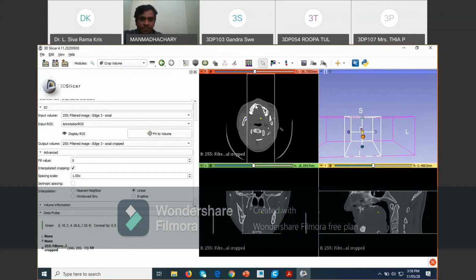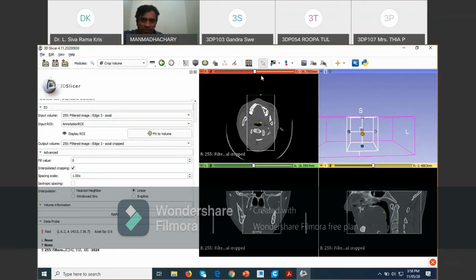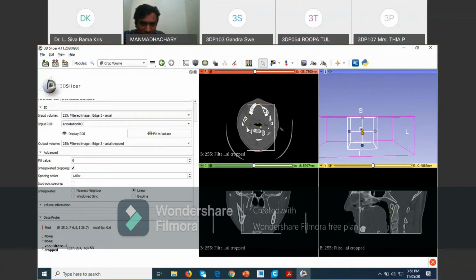Sir, one more thing. After applying, I did apply, but again it went. Nothing came. I don't know why. What happened, madam? Sir, after clicking apply, the image should have come right now. Okay, I will show you here. You have to adjust the cropping before applying. Maybe you did not do any cropping, so that's why it is automatically showing the same images.